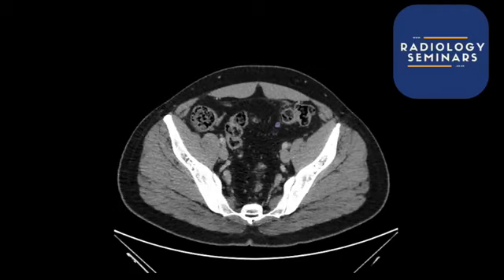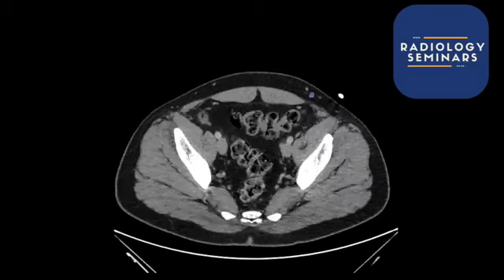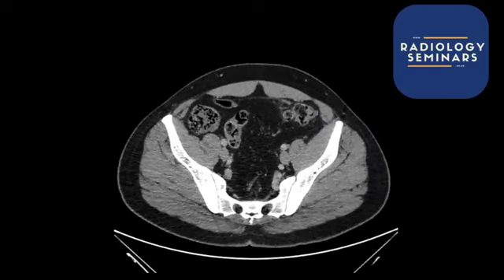And when you've got left iliac fossa pain in a patient, you want to be looking in that region anyway. You want to see if they've got diverticulitis. You want to see if they've got any hernias, see whether there's any sort of bowel poking through that's been causing any of the issues. And then you want to be thinking, okay, if I don't have diverticulitis, I don't have a hernia, but this patient's got left iliac fossa pain, one of the things I want to be thinking about is epiploic appendagitis. That's a very important finding.